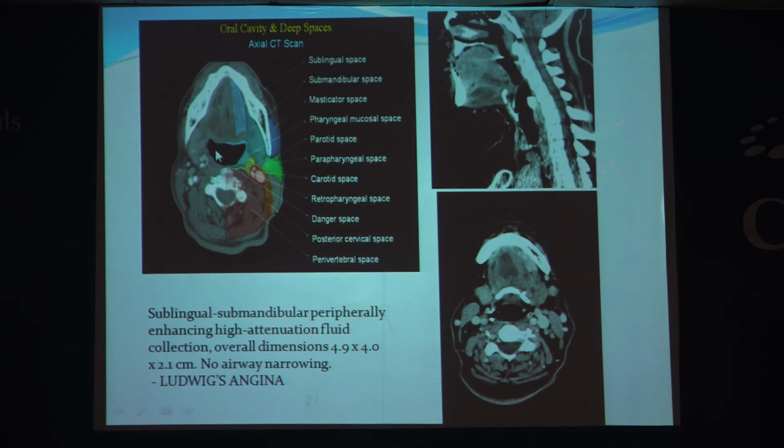This is the pharynx. Lateral to it is the parapharyngeal space, and posterior to that is the retropharyngeal space. Then there is a carotid space that includes the IJV and the common carotid arteries. And posterior to the pharynx will be the vertebra. So space surrounding it is the perivertebral space. So when a lesion is seen in the neck, we identify in which space usually that lesion is.